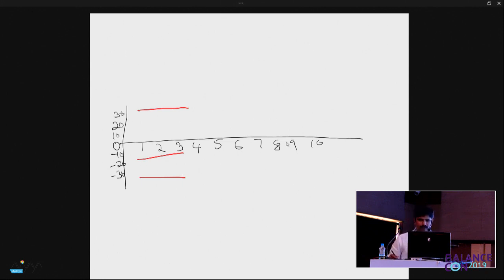Now, this trace means moving to the right side. This trace means starting from the right, crossing the midline and going to the left. So much. Fine. In the beginning it goes slow, but afterwards we'll pick up pace. We need to be sure that all of us understand this.